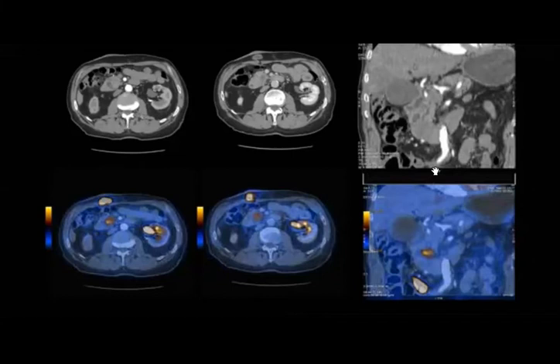So they suspect that maybe this is a pancreatic cancer, and this is what is called, when you deal with PET-CT cases, an entity called second primary. So this patient already has bladder cancer and he was operated on a while ago, but now he developed another cancer, which is the pancreatic cancer. Yes, and yes, okay.